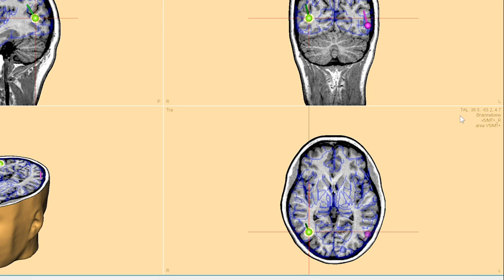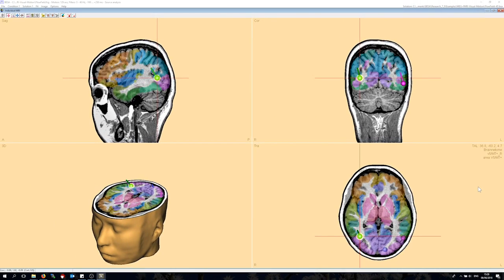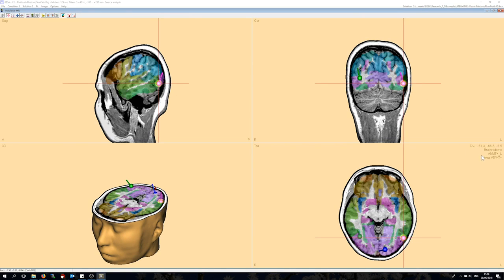I can change the blending mode from the contour mode that is currently shown to a color coding by right-clicking and changing the Atlas blending mode. Two different types of color coding are available. The brain color one tries to assign similar brain areas similar colors. It is apparent that the lateral dipoles both are situated in the V5 MT areas.